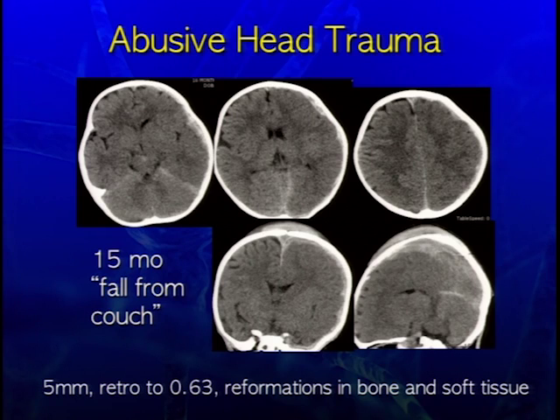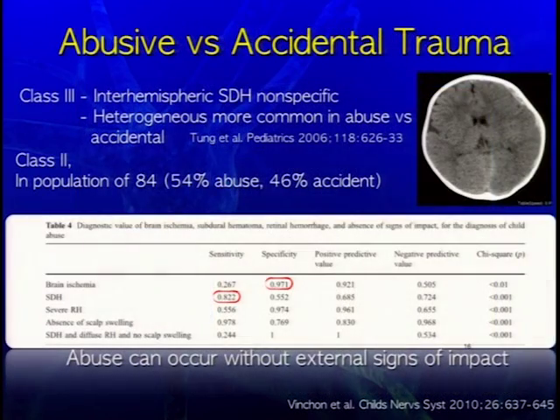Nice subarachnoid spaces, and that linear cortex is well defined and differentiated from the white matter underneath, whereas on the left side, you get the hazy blurring and loss of distinction of that gray-white junction. In addition, you can see a subgaleal hemorrhage collection and actually a cephalohematoma here.